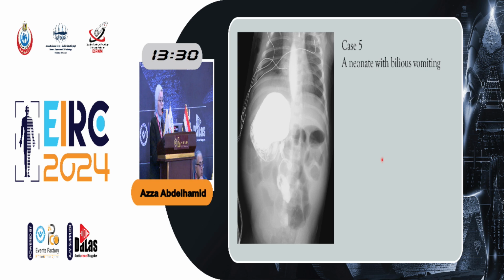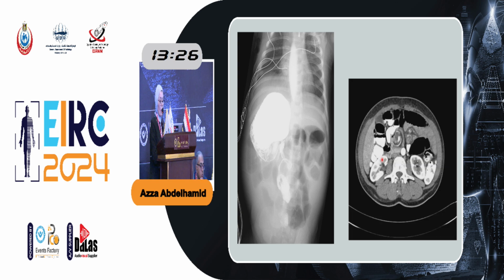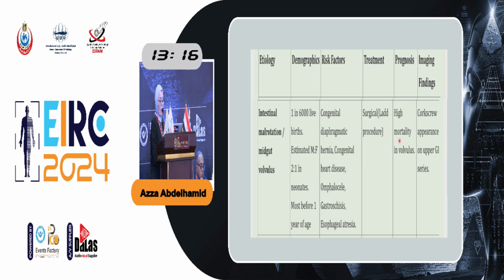So this typical corkscrew, and as Dr. Hussam said, this is what's called the whirlpool sign. Whirlpool means دوامة, okay? So this can be seen with CT.